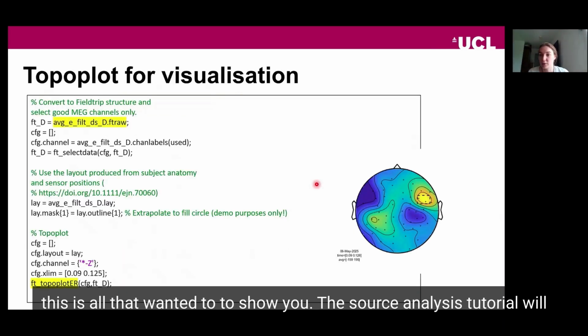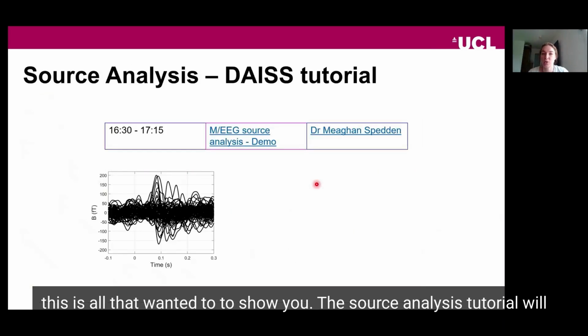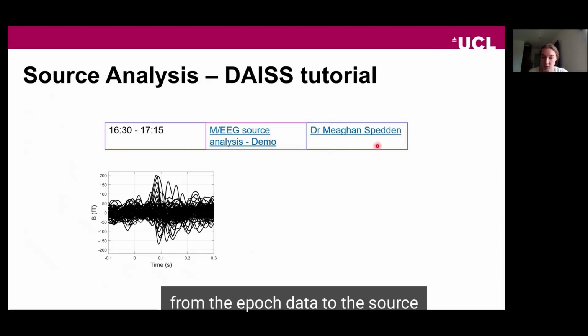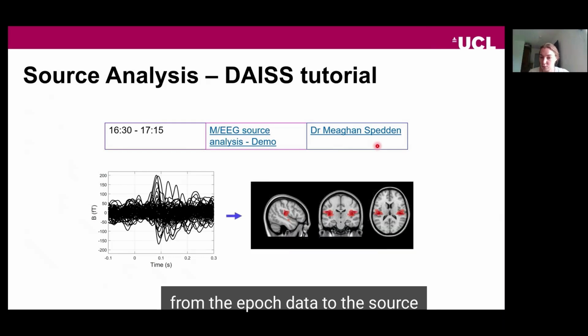This is all that I wanted to show you. The source analysis tutorial will be held later today, I think at 4:30, where Megan will explain how to get from, for example, evoked data to the source level.